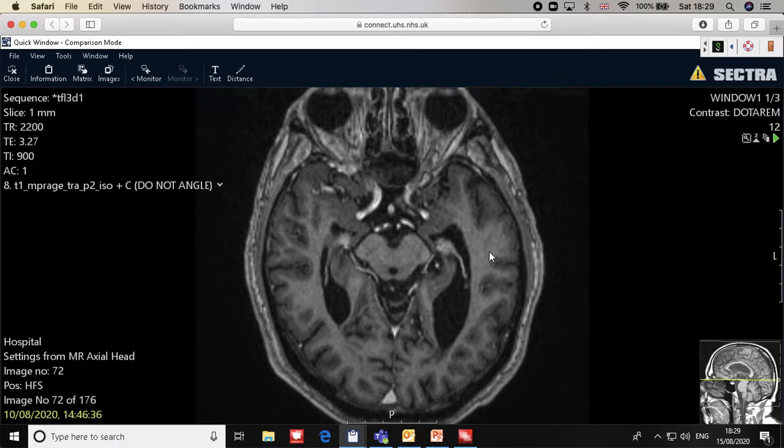But please don't say that in medicine. We have to be very scientific. So you can call it hypointense or hyperintense, or low signal or high signal. If it's white matter, I would say it's hyperintense or high signal. If it's gray matter, it's low signal or hypointense. Try to use some scientific words. Gray and white is for anatomy, or between us only. So white matter is white in T1, and gray matter is gray in T1. In T2 it will be the inverse. In FLAIR it will be inverse. The white matter will be gray, the gray matter will be white.